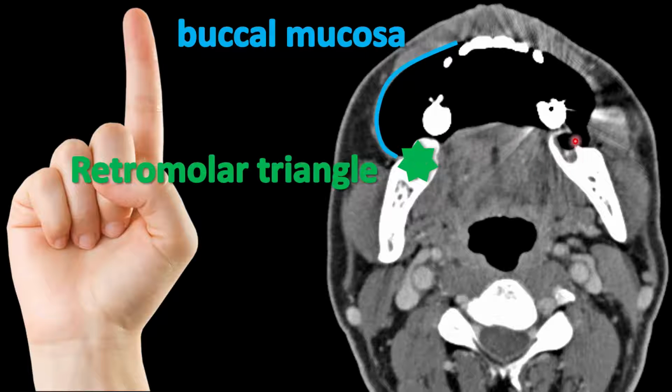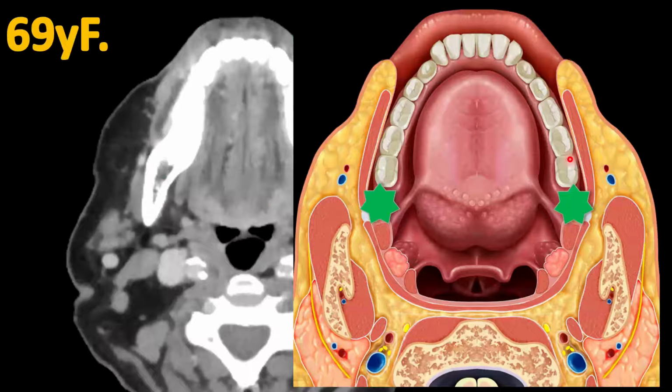You can see this patient has had their wisdom tooth out on that side, and this is actually a huge buccal node just from inflammation after they had extraction of this tooth. Okay, so let's think about that space, the retromolar trigone. What we're talking about is a mucosal surface over the bone of the posterior aspect of the mandible, but we're talking about tumors arising from that mucosal surface.